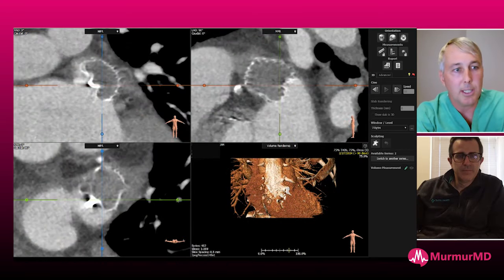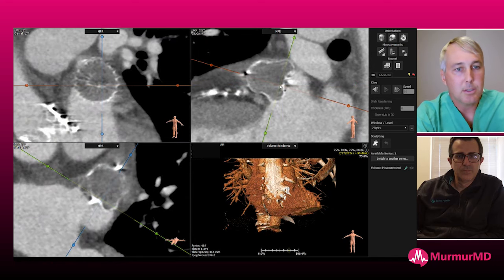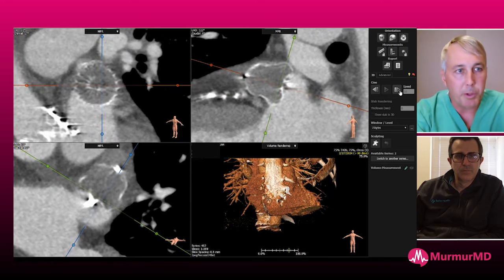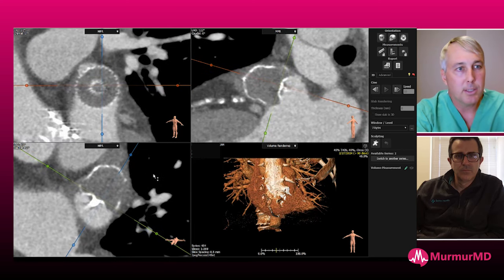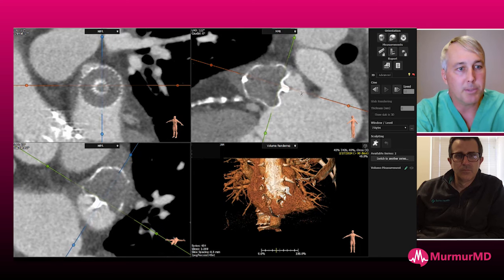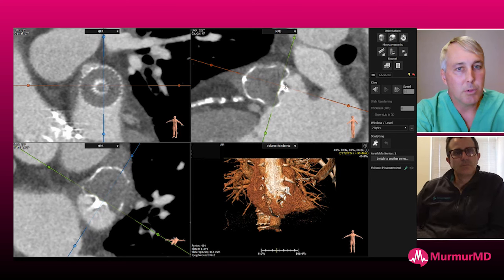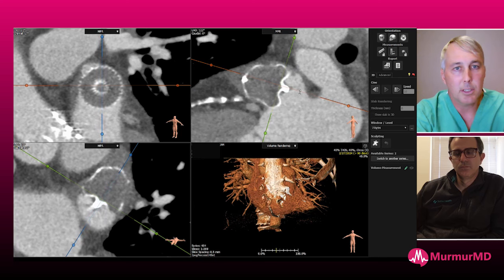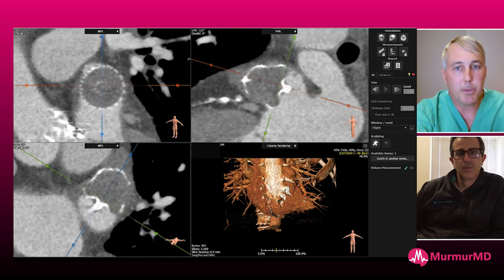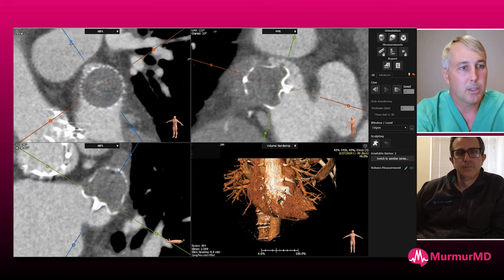So this is another patient post Watchman. In order to take a look, we picked this diastolic phase. I also picked up the systolic phase. So we'll go up to the device and we'll line up our crosshairs on the surface of the device, just like we would when we measured the compressions in the lab. A little bit of motion in diastole. Let's see if it looks better in systole. I think it looks better in systole. So we'll take a look here.